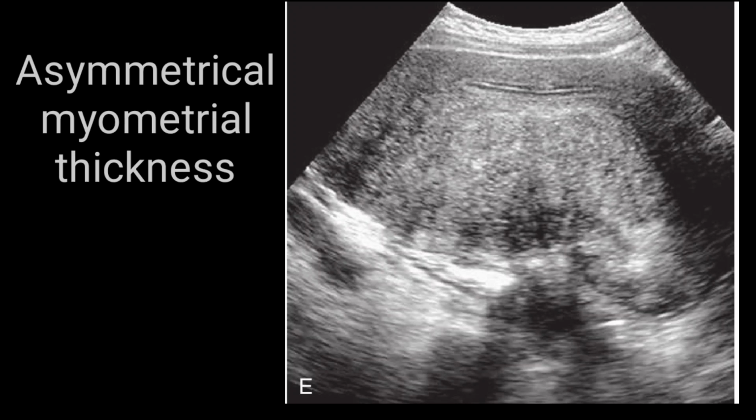So all these points have been discussed on these images, so I will just repeat them for you again. If you come across any striation or nodular pattern 2.5 to 3 millimeters away from the endometrio-myometrial interface, you may consider adenomyosis. If you see multiple small cystic areas within the myometrium, again think of adenomyosis. If the myometrial pattern appears heterogeneous, this would be due to adenomyosis. If the uterus looks globular, adenomyosis can be taken into account. And if there is asymmetrical myometrium, again adenomyosis would be the diagnosis.